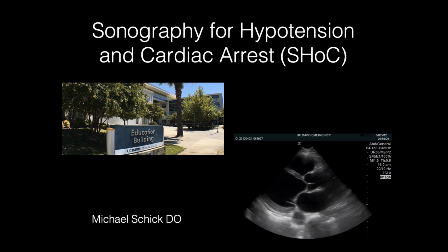All right, we're going to talk about some shock cases, management of the patient with hypotension and shock, and how ultrasound can help. This presentation is really meant for our medical student courses at UC Davis Medical Center. It's good for anyone who's learning ultrasound and using ultrasound in resuscitation.